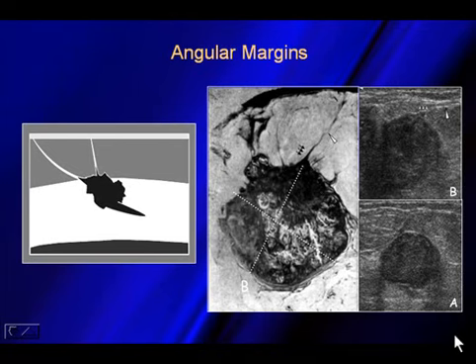Now, in looking at breast cancer, cancer likes to take the path of least resistance. So as a cancer becomes invasive and starts to spread, a lot of times what it'll do is when it hits up against this anterior premammary fascial layer, the anterior premammary fascial layer comes along wherever there's a Cooper's ligament, it goes up, attaches at the skin, and comes back down.